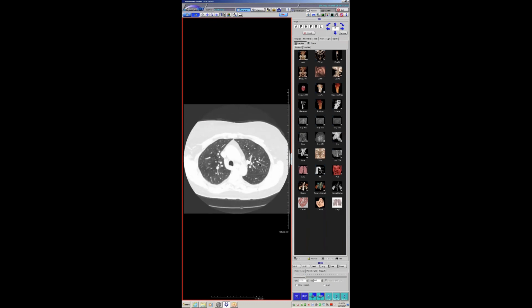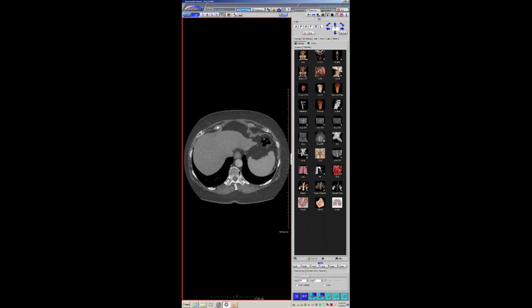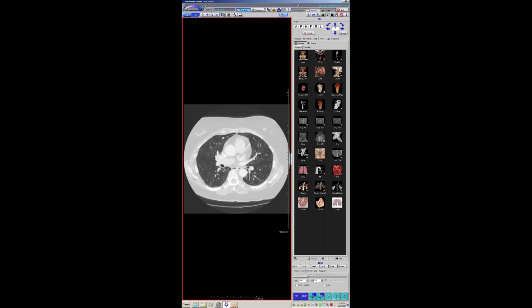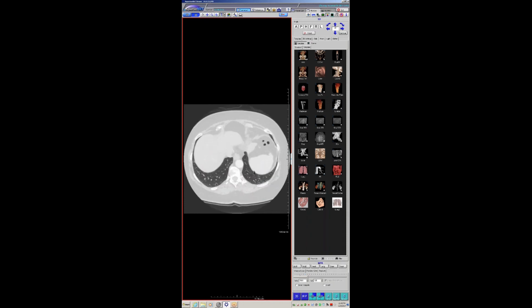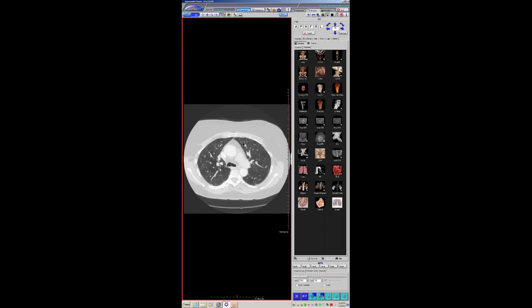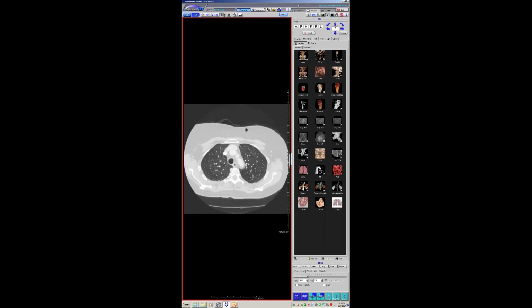The first scan, this one I caught it on. So here was a woman with diagnosis as metastatic breast cancer. She's got bone mets. She's got some nodal mets. And when I read the study last time before this, she has all these scattered pulmonary nodules all over the place. Also noticed is the nice mosaic attenuation, which was more conspicuous on the current scan, because I think she was at some degree of, well, no, it actually was the same.